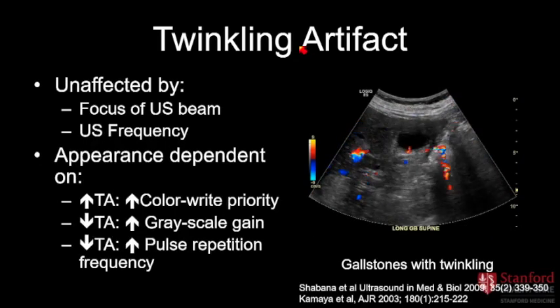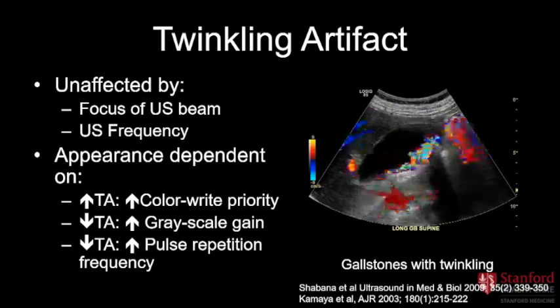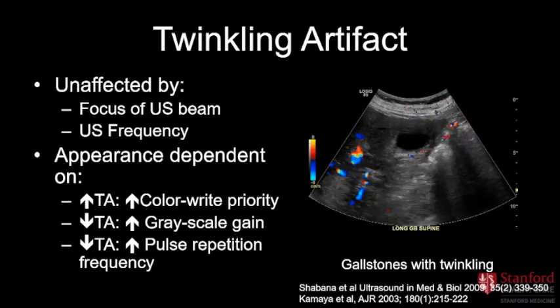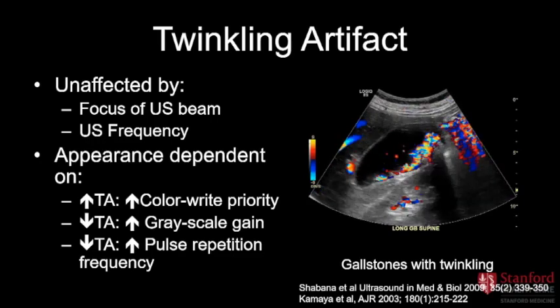With twinkling artifact, it's useful because it is not affected by the focus of your ultrasound beam. So sometimes you'll see an area of twinkling where you're not actually focusing, and it helps to draw your eye to that spot. It's also not affected by the ultrasound frequency.